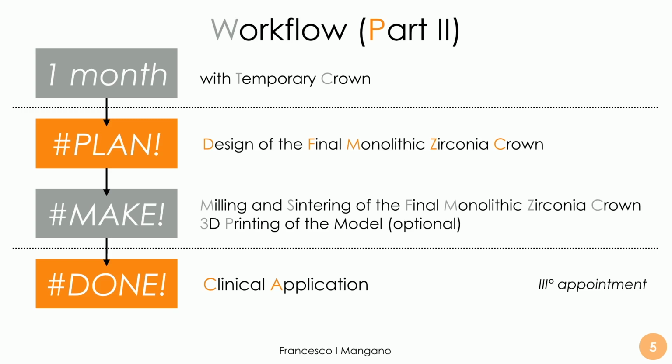The dental technician simply modifies the design of the crown and the cement gap for the final crown, because different materials have different cement gaps. Eventually, what we can do is make a scan of the temporary crown in position, in order to give additional information to the dental technician to help him model the final crown inside a functionalized area.